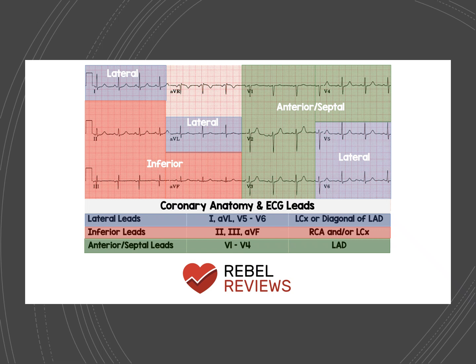And in an actual STEMI alert, one of the first things we're going to check is whether there is ST elevation and which lead the ST elevation is in, because that will tell us which part of the heart is in trouble and which coronary artery is likely blocked. This will help us guide and localize those myocardial infarctions and then communicate clearly when we activate the cath lab team.